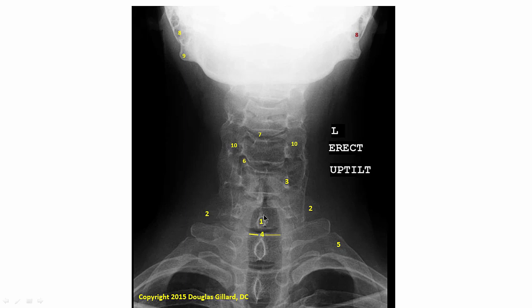Vertebral prominens. Okay, that's the spinous process of which one? Well, this is T1, this is C7. Spinous process of C7, spinous process of T1, really easy to see there. So pedicles, number 3, uncinate process is number 6, and you can count up, that would be C7, C6. So of C6, you can even say on the right. Remember, on the test, make sure you say left and right.